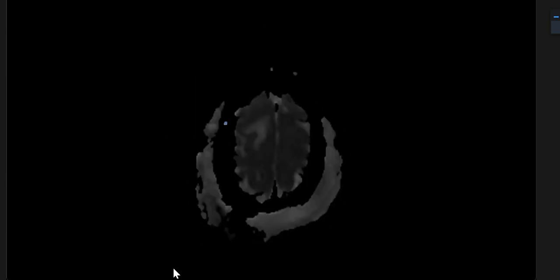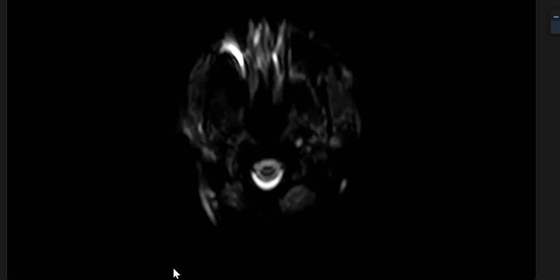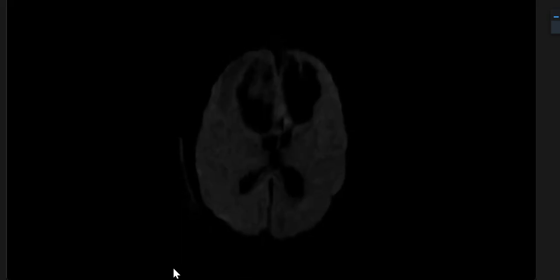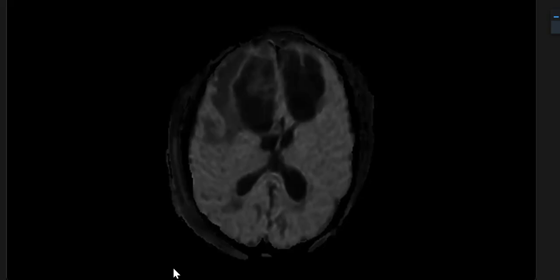You have high B value, if you scroll down. I think this is the last cut, doctor. Let's assume there is diffusion restriction.